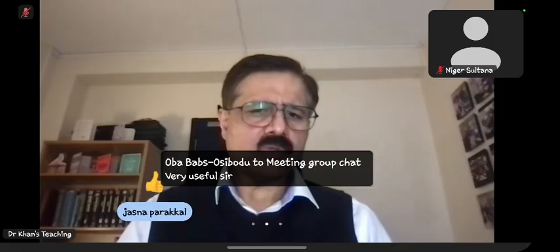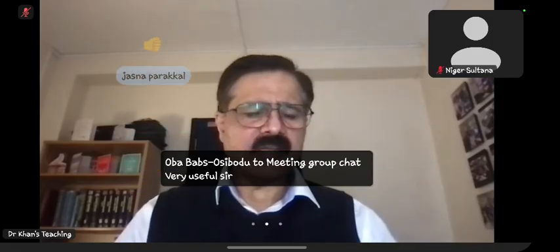Now, easy case. I've selected bread and butter type of cases for you. Please remember that the format I am going to use in the next few sessions is CT and MRs, and I want to do a bit of teaching just like I'm doing today. So tell me in the feedback if you find it useful. Because I'm describing it, I'm giving you a bit of theory. Unfortunately, what I have learned is that if I start displaying PowerPoints also, it becomes a bit too much. So I'm doing it just on the scans. And if you like it, I can continue.